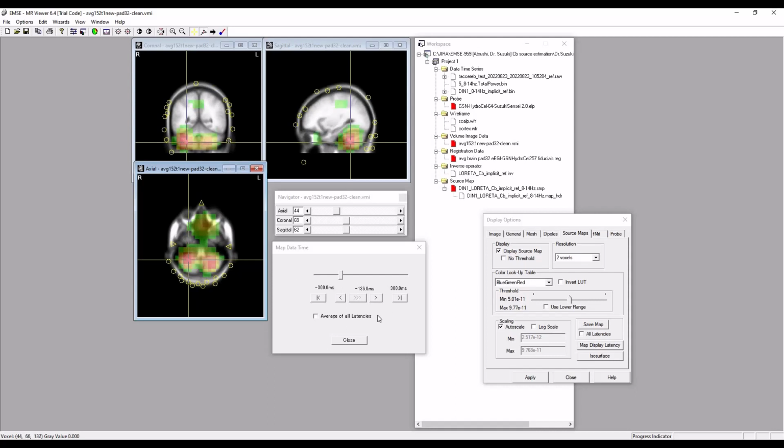So now we've got the whole time series. We can look at it before and after. Let's look after the movement. Yes, even that's before the movement still. So there are oscillations before the movement. We're still not at the movement yet. Now 8 milliseconds. Okay, they're right at the movement. We're not seeing anything at that moment. But after the movement, some cerebellar activity returns.